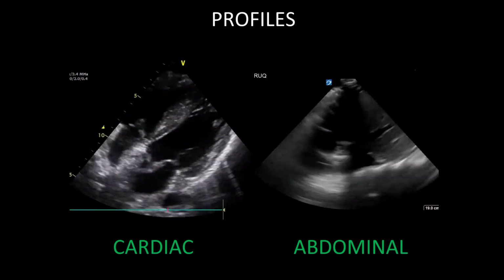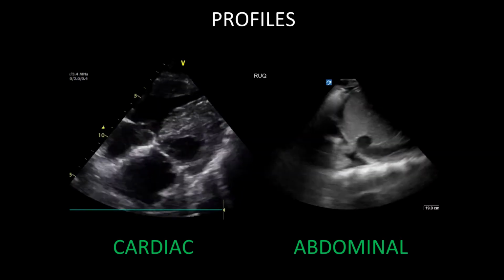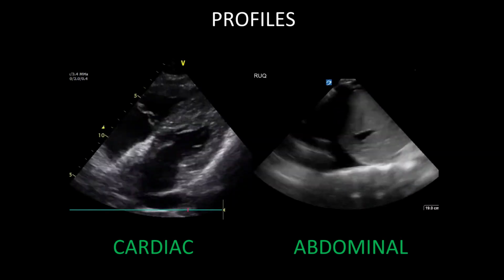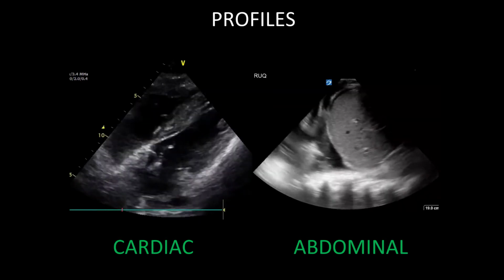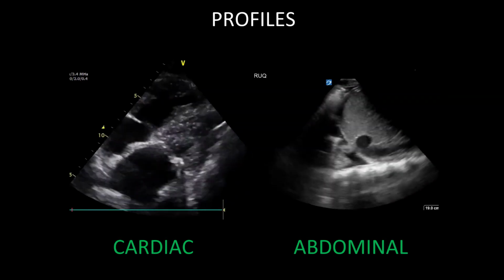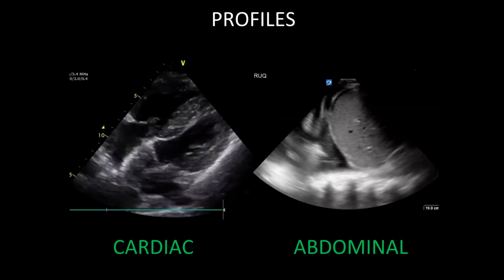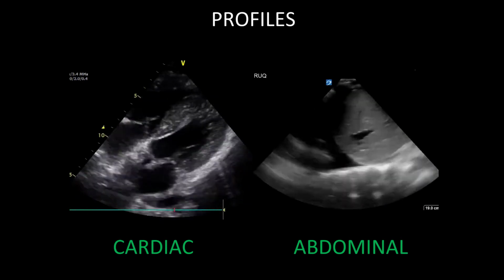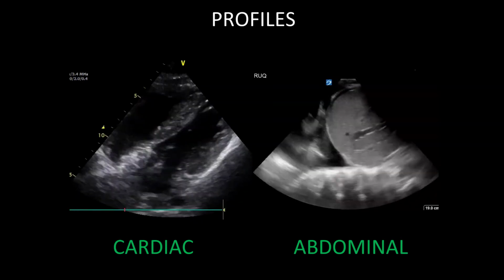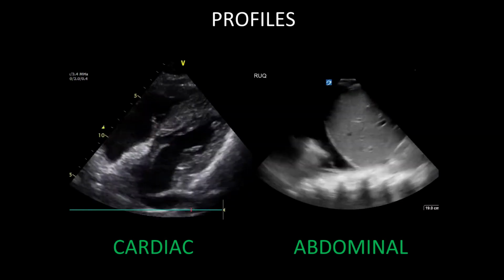For a general user, knowledge of these is not typically necessary. Selecting the appropriate profile is the only thing that matters. Notice here that the two profiles have vastly different characteristics, such as different gray differentiation, frames per second, and others. The two profiles most commonly used will be the cardiac setting and the abdominal settings for non-vascular use. Some machines have additional profiles such as lung or beeline. These can be used for these specific instances.